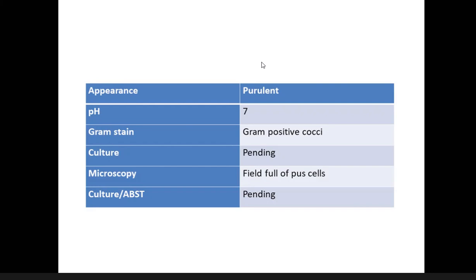If you are given just the chest X-ray alone, then the radiological diagnosis would be right-sided pleural effusion, right? But with the history, you have to suspect right lower lobe pneumonia leading to parapneumonic effusion. That is what we normally see in our setup, isn't it?